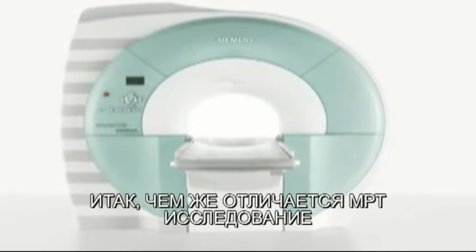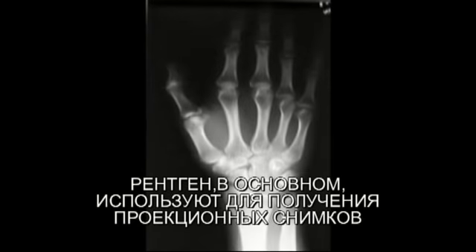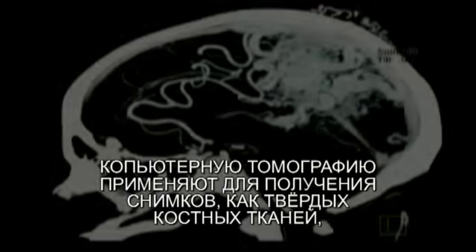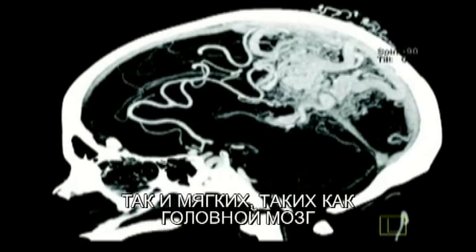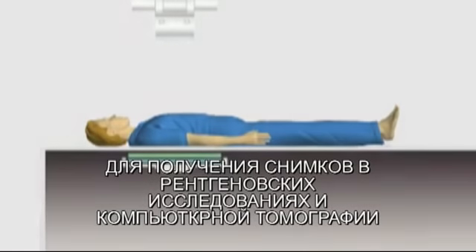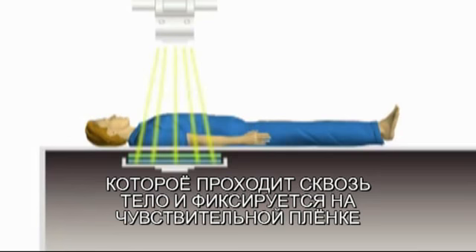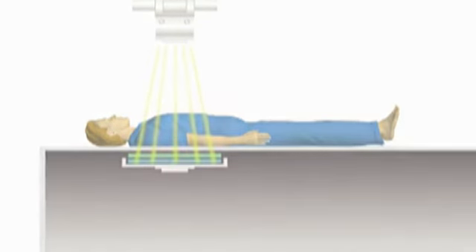Just what makes MRI so different from other medical imaging techniques, such as conventional X-rays and computed tomography? X-ray devices are generally used to take projection images of hard tissues like bones. CT scans take images of both hard bony tissues and soft tissue, such as the brain. Both X-ray and CT systems use X-ray beams, which travel through the body and project an image onto a photographic film or display it on a video monitor.